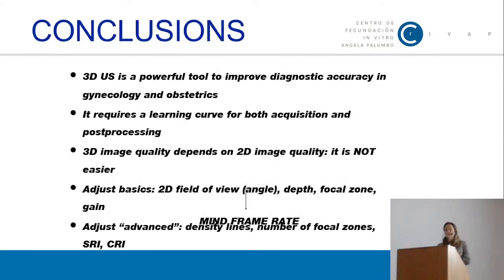So in conclusion, 3D ultrasound is a powerful tool to improve the diagnosis and accuracy in gynecology and obstetrics. It requires a learning curve for both the acquisition and the post-processing. 3D image quality depends on 2D, so it is not easier. It depends on our skills with 2D.